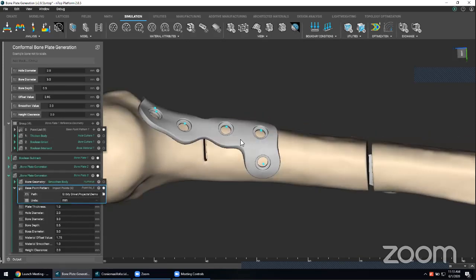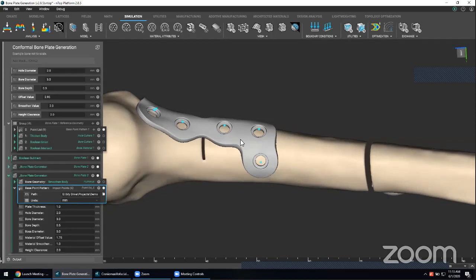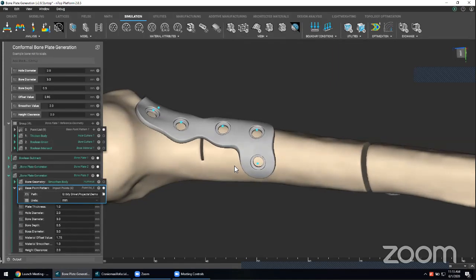So I've been referring to points a lot, but when I say points, I don't just mean these points that you see in coordinate space. What I also mean is that a surgeon can actually look at the shoulder of a design engineer and point to the locations where his experience tells him these bone screws should go. And the design engineer can use a workflow like this to generate a bone plate solution that matches both the patient's needs and the surgeon's needs based on his experience.